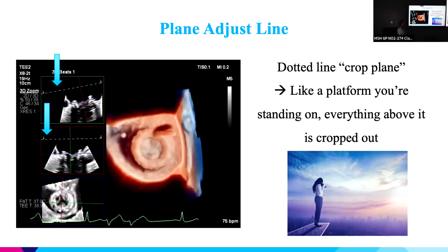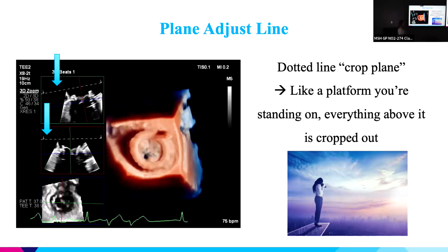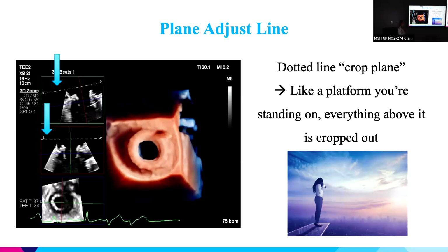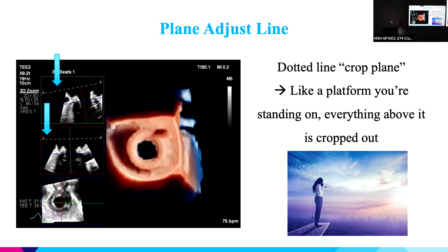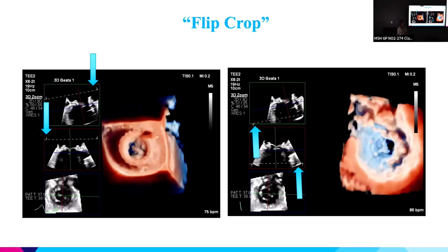Any questions? Yeah, what do you push to make it flip? Like on your console, I don't have an image of it. There it says flip crop on the touchscreen. Touchscreen on the right. Yeah. Okay. Oh, here, flip crop.